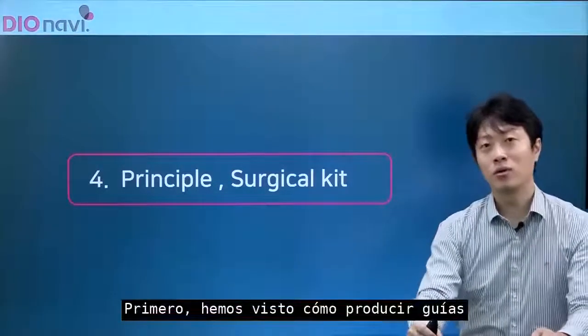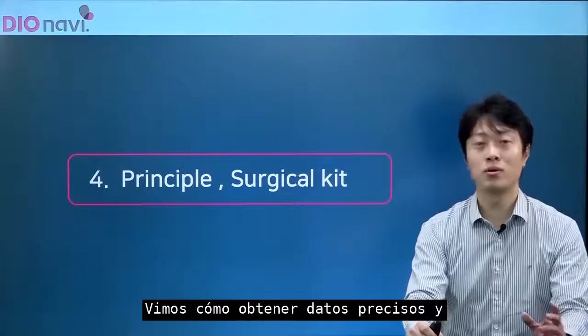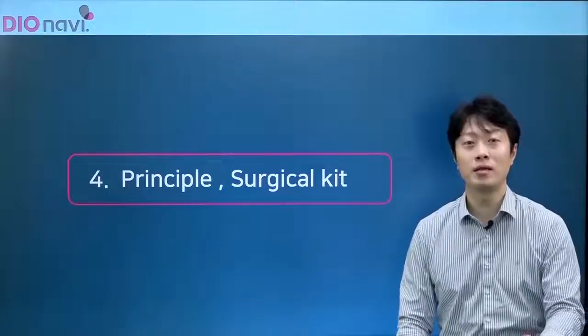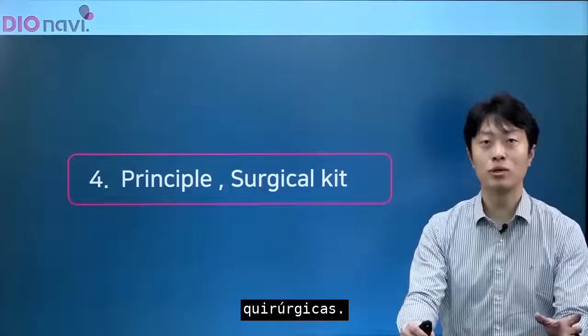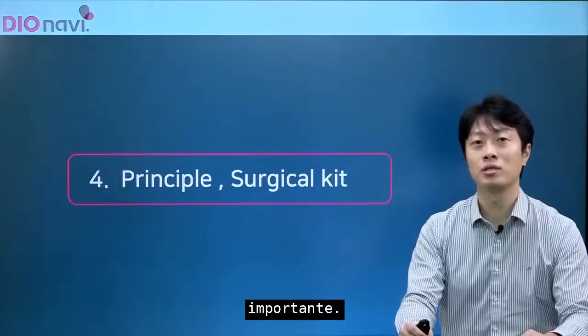Thus far, we have looked at how to produce accurate surgical guides. We saw how to obtain precise data and produce precise surgical guides. The DIOnavi surgery relies on surgical guides, so accurate production of the surgical guide is extremely important.